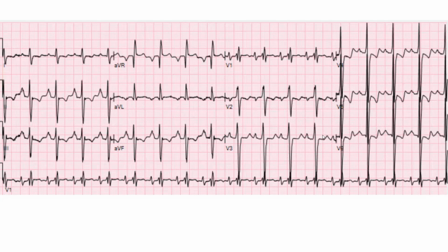So what's the diagnosis? Is it biventricular hypertrophy? Yes, it's biventricular hypertrophy. It's massive biventricular hypertrophy. There are so many criteria for that. And there is one criterion I want you to know. In the mid to lateral precordial leads, when you have a huge biphasic QRS, a huge R and a huge S, with the summation of R and S, the whole QRS more than 50 millimeters, this is what we call, it has a name, Katz-Wachtel. It's a highly specific sign of biventricular hypertrophy.